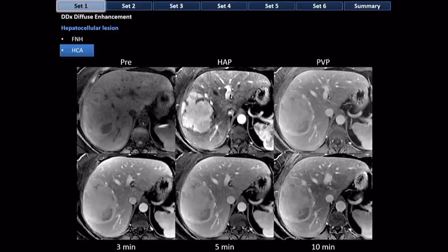And as Dr. Clausen said, these inflammatory hepatocellular adenomas tend to have telangiectatic change. They tend to have dilated sinusoids, so they hold on to the contrast on the delayed images. So notice that at 5 minutes and 10 minutes, most of this mass is hyperenhancing relative to the liver. Now, at the 4 to 5 o'clock position, you'll notice that there's an area of darkness in this lesion, which on the in and out of phase images was fat. So notice that these inflammatory hepatocellular adenomas can contain a little bit of fat, but unlike the HNF1 alpha inactivated adenomas, they're not diffusely steatotic.